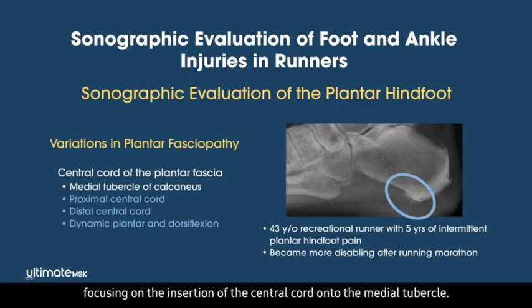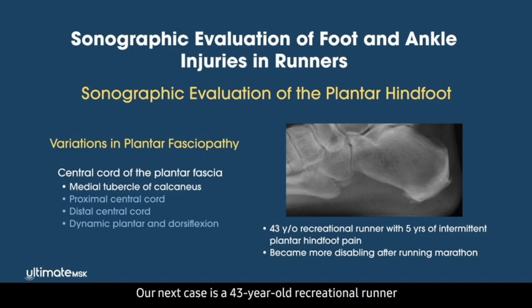Focusing on the insertion of the central cord onto the medial tubercle, our next case is a 43-year-old recreational runner with 5 years of intermittent plantar hindfoot pain. Her symptoms worsened significantly after completing her first marathon. A standing lateral radiograph shows the typical enthesiophyte at the insertion of the central cord.